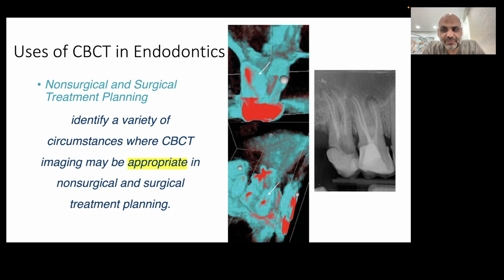it was just normal, and the patient has complained of pain. 6 has a periapical lesion confined to the mesial root, which most probably coincides with the presence of a missed canal and infection in the sinus. That's why it wasn't very clear for the dentist that the 6 was the cause of the pain.